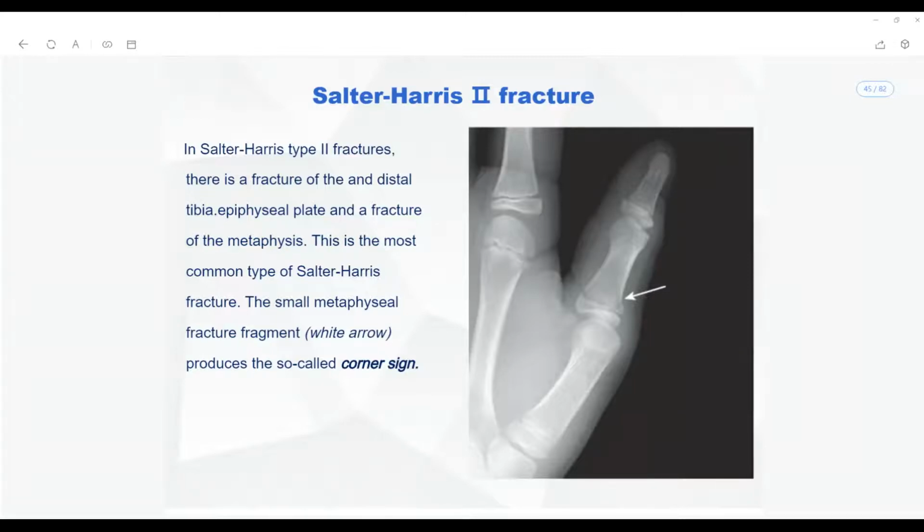Be it a humerus, where it has something like 6 parts, sorry, it will have 5 parts before the ossification. When the ossifications are complete, it forms a single long tubular bone. The same way here also, in the metacarpals, they are long bones as well, but still they should be fused to form a single segment.